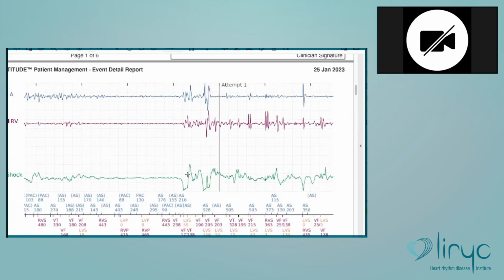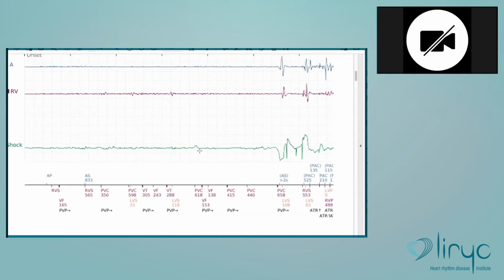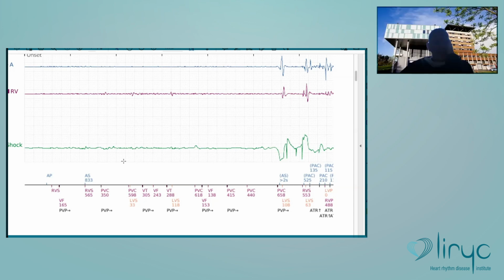Large amplitude signals, saturation of the amplifiers on the three channels. What happens here? It's something like a flat signal, without anything. What kind of surgery could it be?